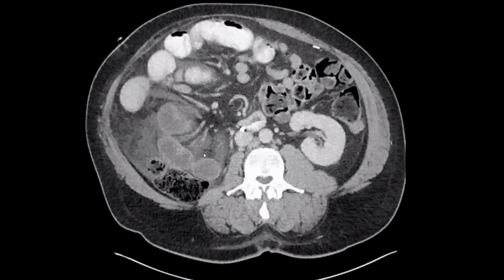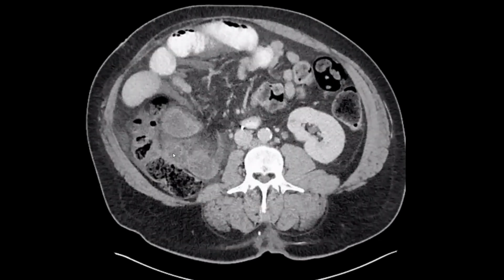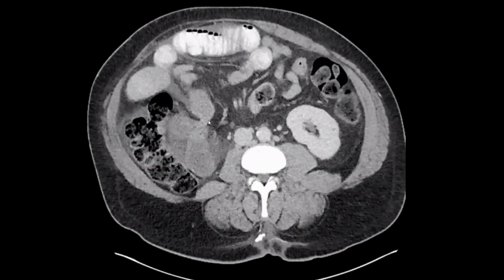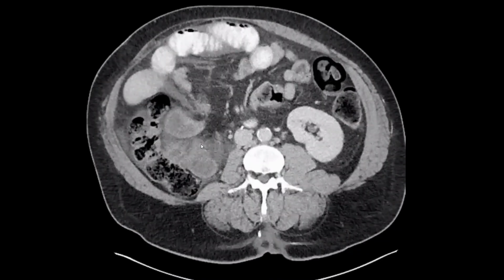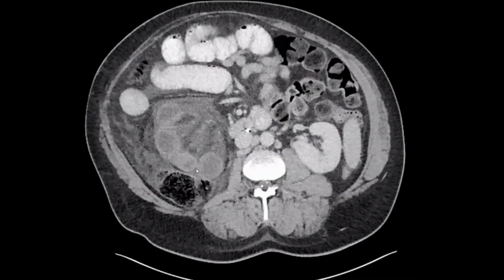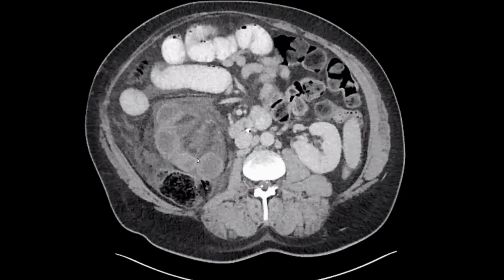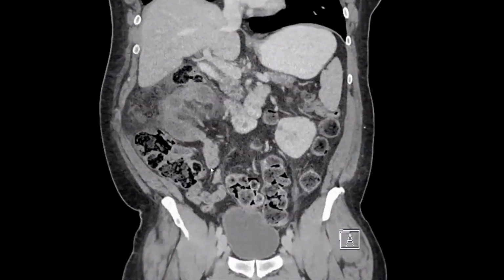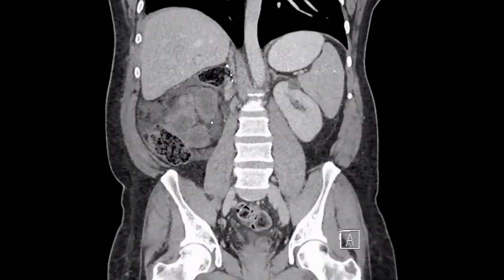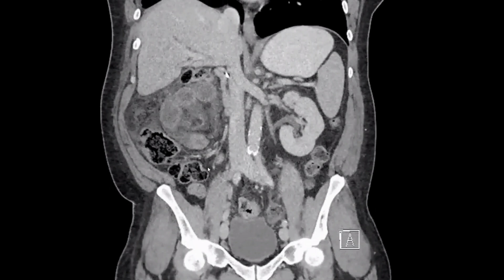Yeah, you are right. There is a high risk of strangulation and bowel ischemia because we have two causes of the ischemia here, because we are at a transition point. Yes, sir. And also the dilatation itself makes hypoperfusion of the bowel loops. So we have a high risk of ischemic bowel changes. Okay. Thank you so much. If you want to see the coronal plane, I think it's very easy to see the closed loop obstruction.